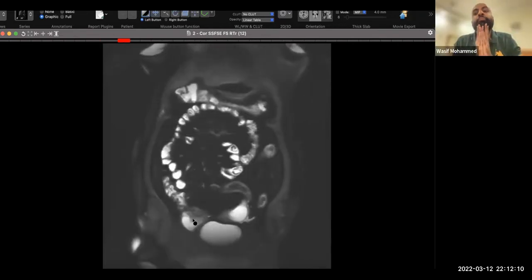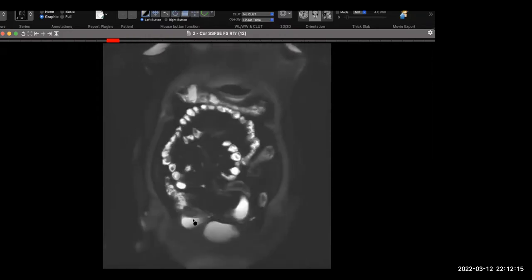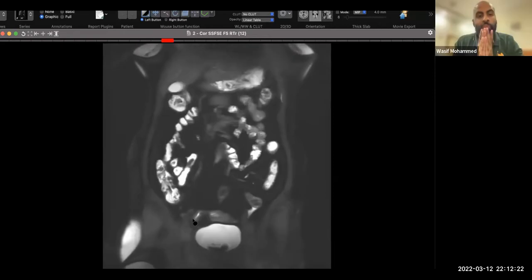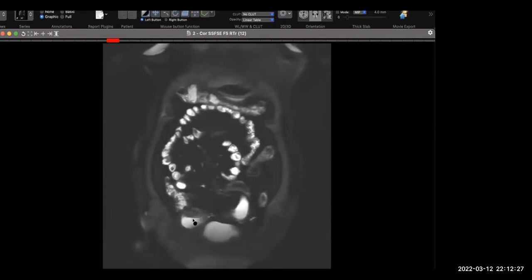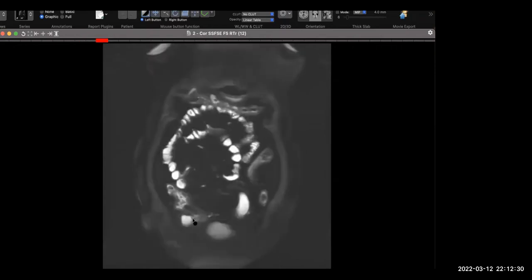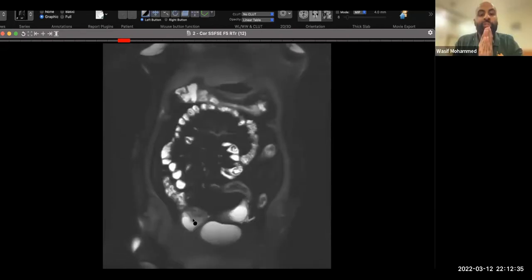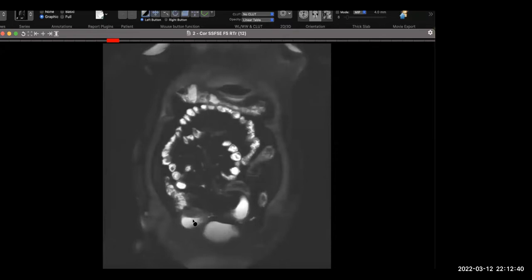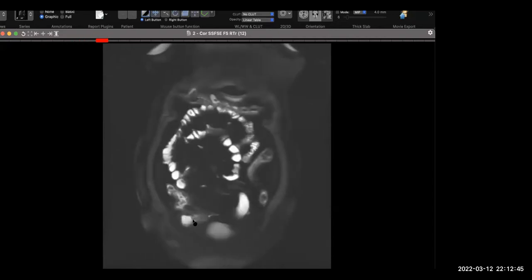This could suggest a possible perforation in a case of Crohn's, because they do present with small collections. What's a more simpler explanation rather than perforation? A simpler, this could be an aneurysmal dilatation of the bowel loop itself. No, for the extraluminal fluid in the abdomen or the pelvis, what do you first think of? Free fluid. Yeah. So this could just be free fluid.